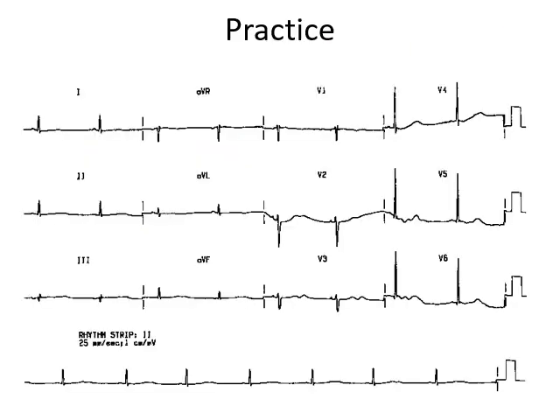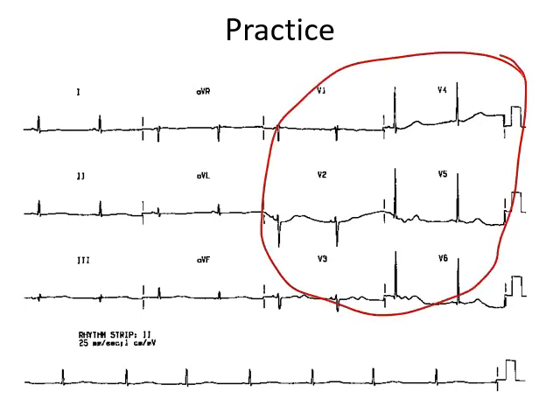Let's have a look at few ECGs. I want you guys to focus on chest leads only. Now you can see that in this ECG, this is Q wave, this is R wave, there's no S wave, then there is T wave, and then this is U wave. Now the immediate positive deflection after T wave is a U wave. So this is an ECG of hypokalemia.